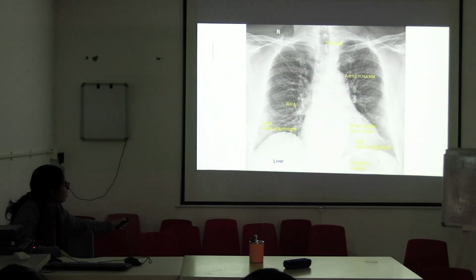Just look at it. Left border eta bolechilam na aortic knuckle. Pulmonary bay ta ekhane hoy, tar tole pulmonary bay, then you are getting to see the left ventricle. Right heart দেখো উপরটা পুরো superior vena cava is there. তলাটা right atrium. মধ্যখানে ascending aorta, a small portion is there. Okay.